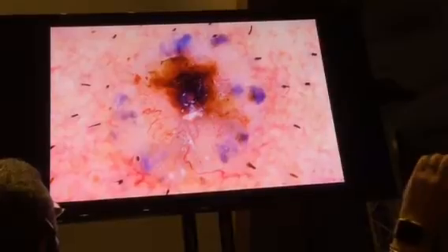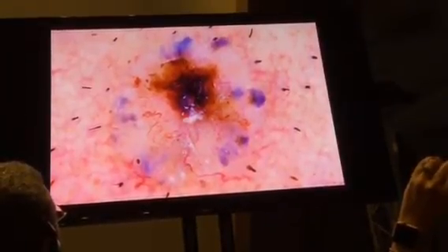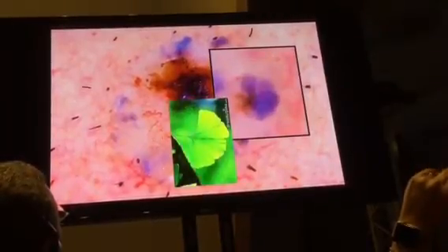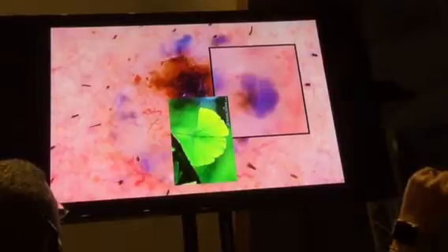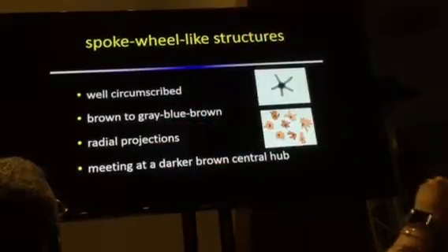Sometimes they're a little bit more bulbous in appearance. Sometimes they're really round, and beginners often misidentify this particular type of leaf-like structure. Some people have said it looks like a ginkgo leaf. Here's another example, more of the roundish, bulbous, as opposed to the very fine projections of the leaf.